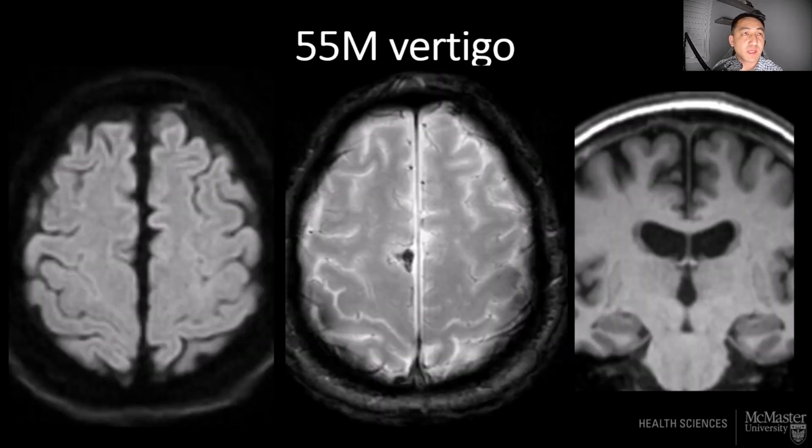Instead of a CT angiogram, they did an MRI, which is not that helpful. It shows typical features of hemorrhage. If you're concerned about subarachnoid hemorrhage, you really need to do a CT angiogram to rule out aneurysm or vascular cause.